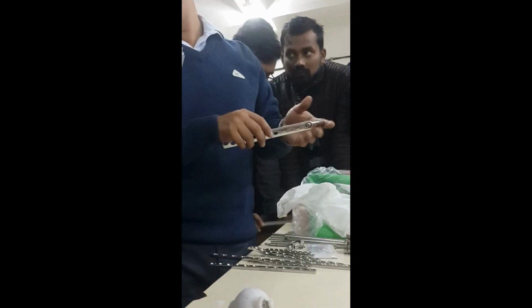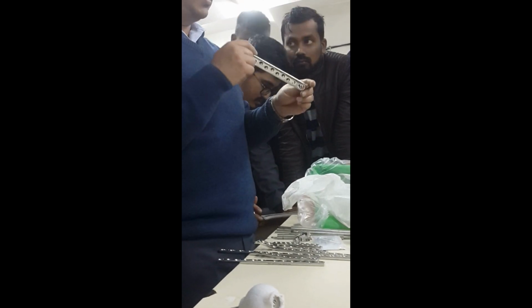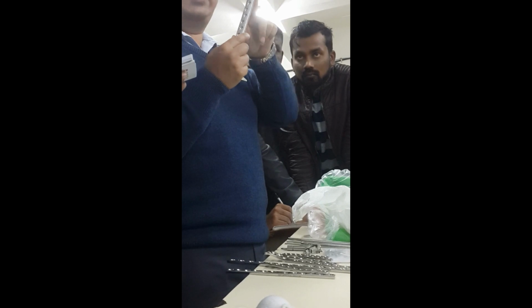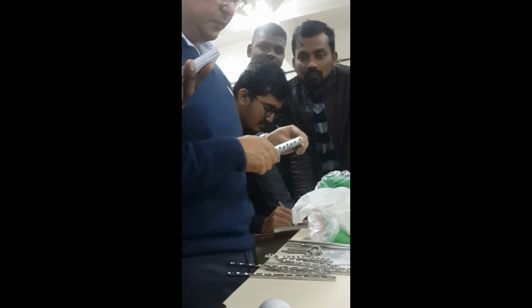Yes, clear. Condylar. But the D means dynamic. Here it is illustrated as dynamic, right? But the DCS is not actually dynamic like that, but the name is DCS.